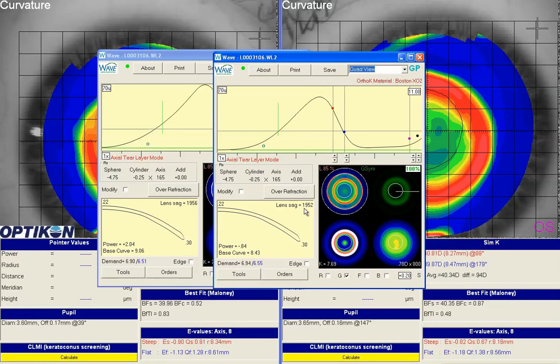We're at about 5 microns or 4 microns more shallow than originally, just from adding the asphericity and making our changes to the topo demand. So I think a reasonable target is anywhere from 10 to 15 microns. Since we already made a previous change, we did help. 10 to 15 microns, I think, is a significant change, but if we're really going to try to affect something, then we can definitely do that. So 1956 will be 1946, our new target.